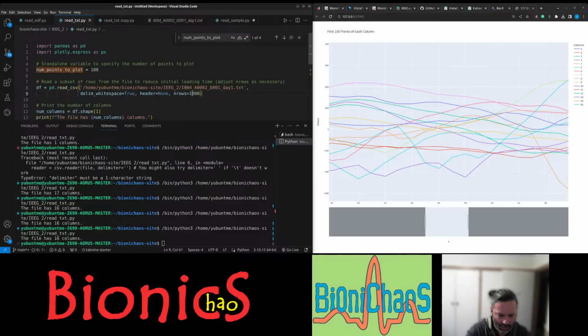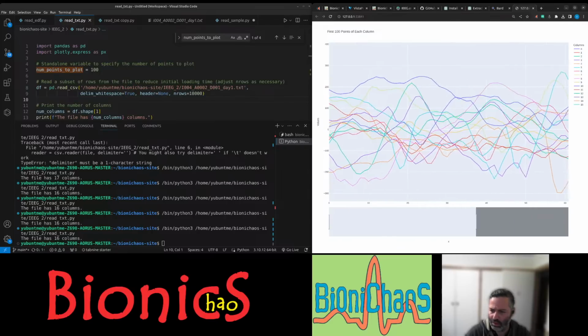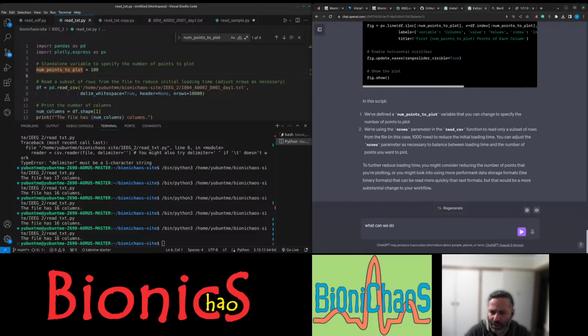Okay, let's. So what if we load 1,000 points? Don't get it. Explain that to me.